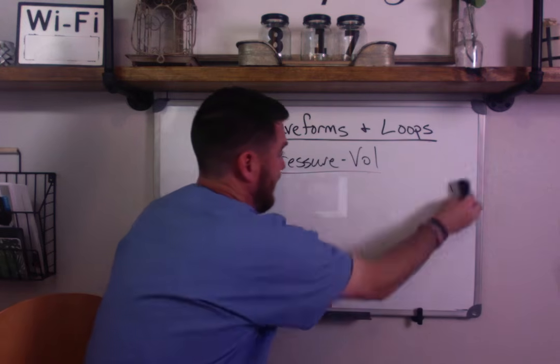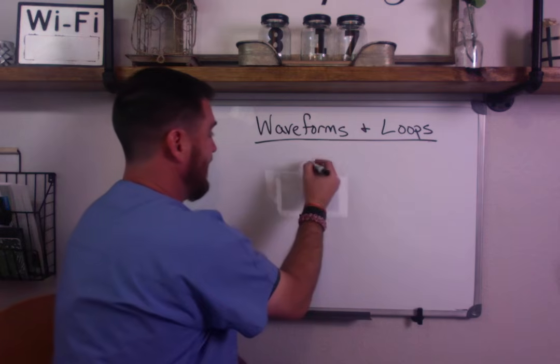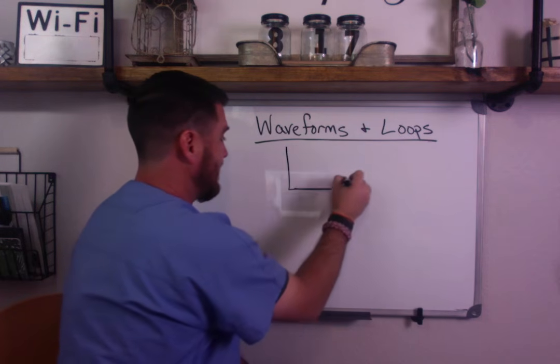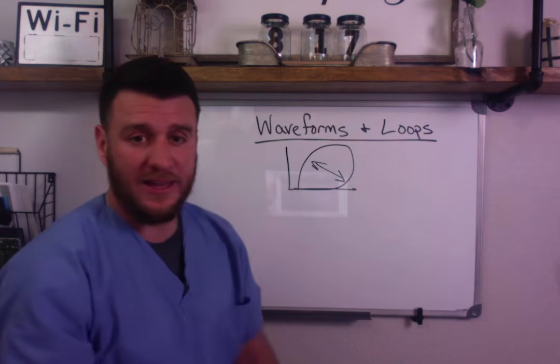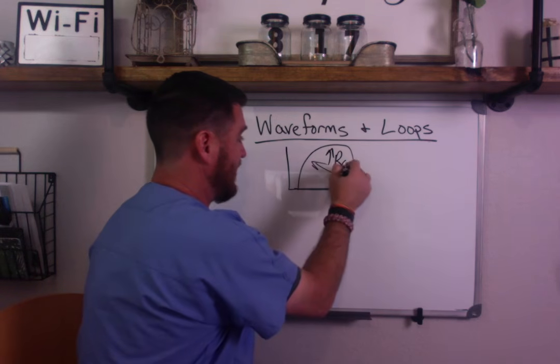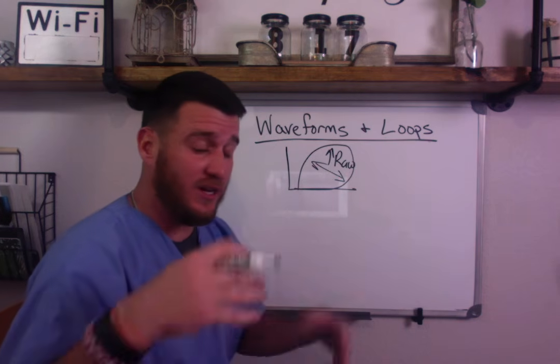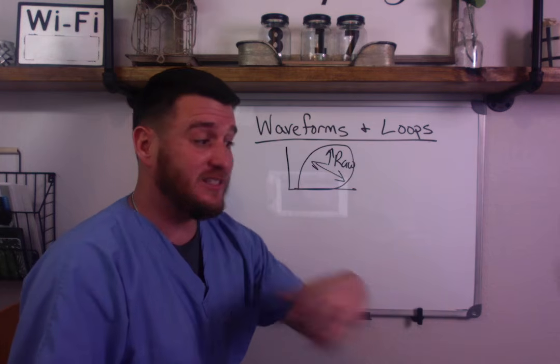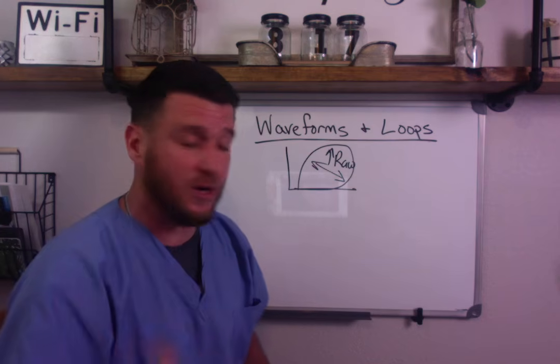I'm going to put all this together. If you have a patient that comes in status asthmaticus and you have a very wide pressure volume loop, right? Now we know that status asthmaticus comes in. This tells us we have an increase in raw. Okay? Well, what do we know about status asthmaticus? We know that because of the bronchospasm, they're going to air trap because they are unable to fully exhale all of their volume. We also know that they have an obstructive lung disease.